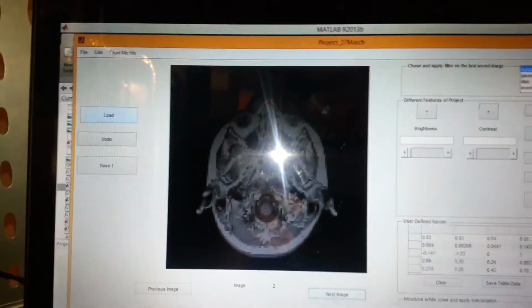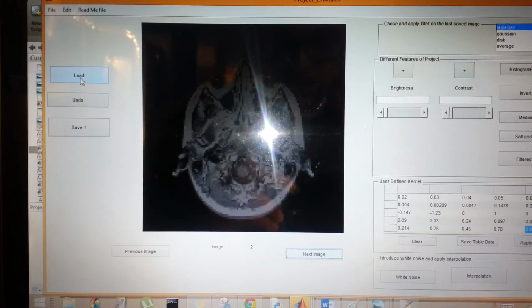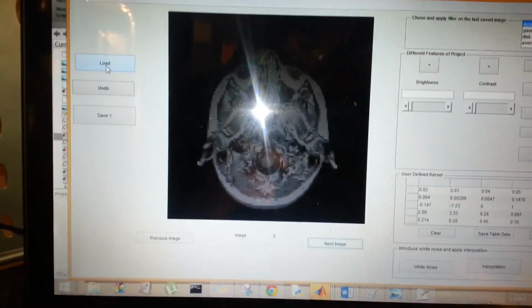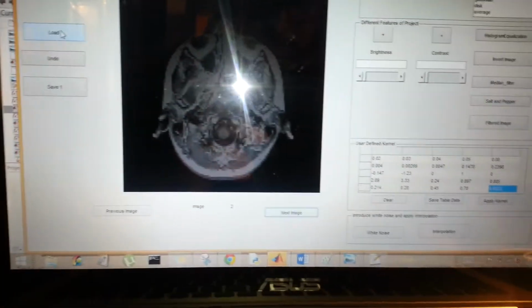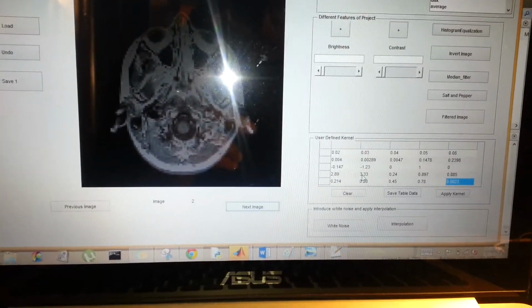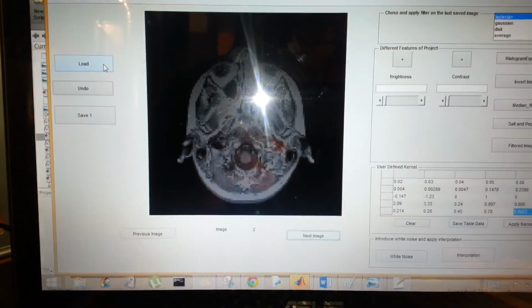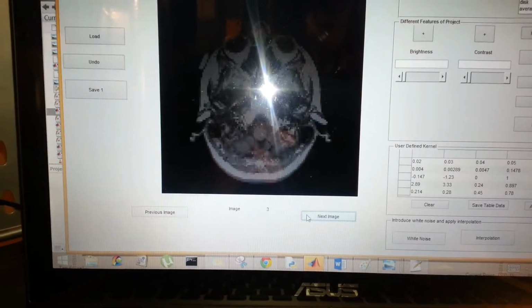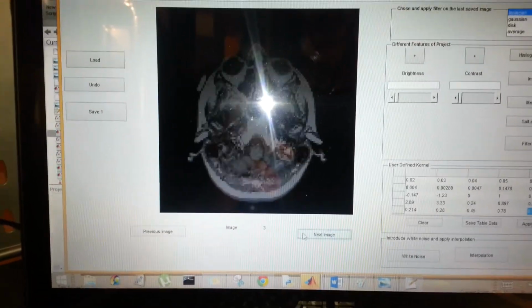Okay, so I uploaded a set of MRI scans. These are grayscale images loaded by the load button. Unfortunately, I cannot load it again, otherwise this value would be lost. The table simply works when pressing this button and loading with the base name T. And I have 5 values here.